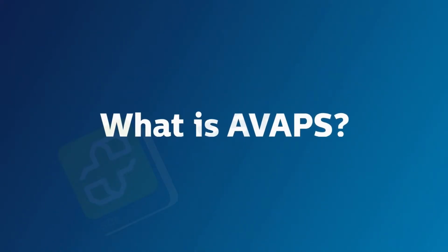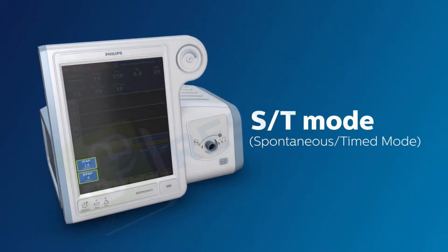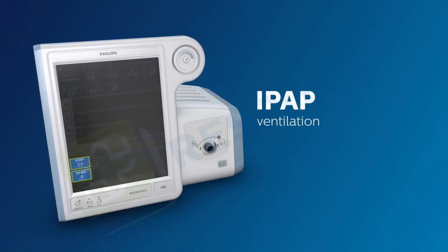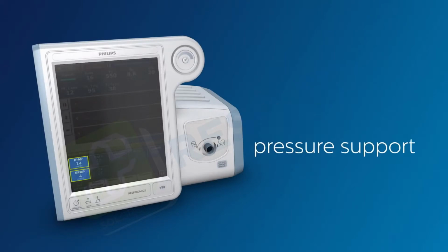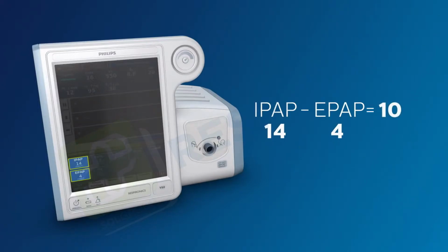To help understand how uniquely revolutionary the AVAPS mode is, let's compare it to another great mode, the ST mode. In the ST mode, IPAP and EPAP values are set here. The IPAP is set to manipulate and improve the patient's ventilation, while the EPAP control is adjusted to help improve the patient's oxygenation. The difference between the IPAP and EPAP is pressure support. In the example provided here, the pressure support given to the patient is 10 centimeters of water, because IPAP of 14 minus the EPAP of 4 equals 10.